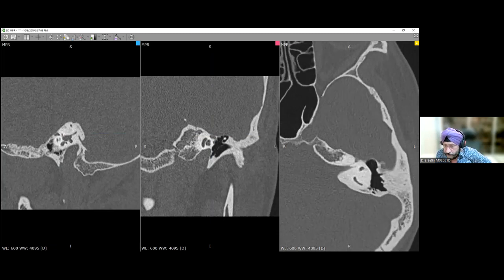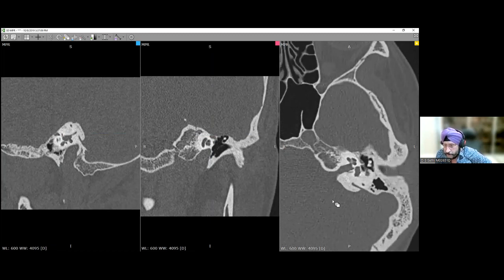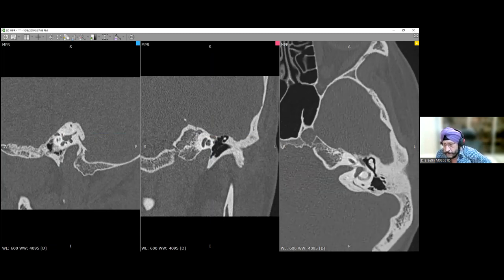Now, what I'd like you to see here, this vestibular aqueduct has a J-shaped configuration. Look at that. So here, and then it goes down, J-shaped configuration. All right. And that is very good. The maximum diameter of this is roughly about 2 millimeters or so, but it can narrow down to about 1 millimeter. So let me just go on now more inferiorly.